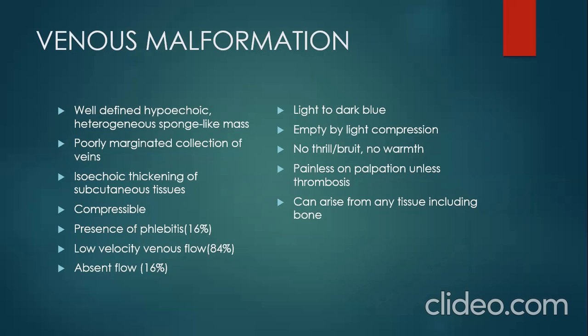There's no thrill or bruit in this lesion, and usually it's not painful unless there's a thrombosis. It can arise from any tissue, even including the bone. On ultrasound, we will see a well-defined hypoechoic heterogeneous sponge-like mass, and it is poorly marginated.